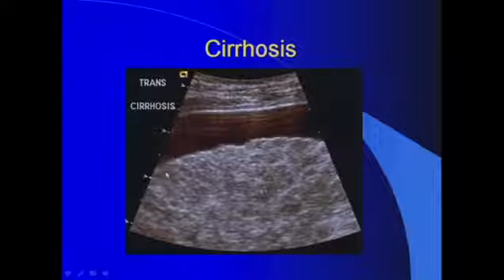Another example of changes that you can identify in cirrhotic patients, in addition to the nodularity of the surface that you can see here at the interface of the ascitic fluid anteriorly, are these multiple hypoechoic lesions scattered through the liver parenchyma, and these cannot be adequately characterized by sonography. However, all you can say is describe them, and most likely they may represent regenerating nodules, but an HCC among any of these could be a possibility, and further imaging with MRI may be helpful to better quantify this nodularity and these nodular lesions in this liver.